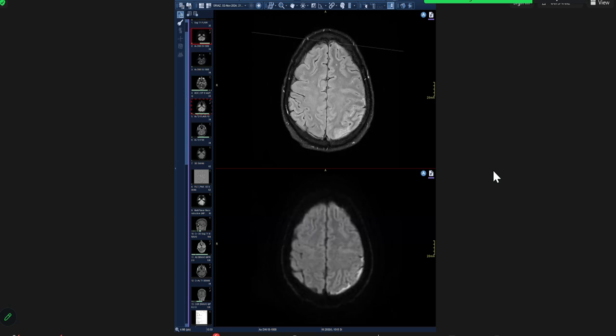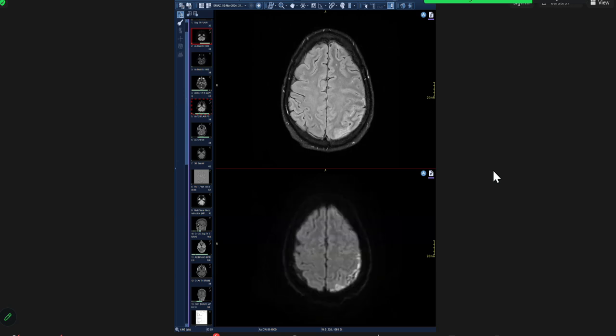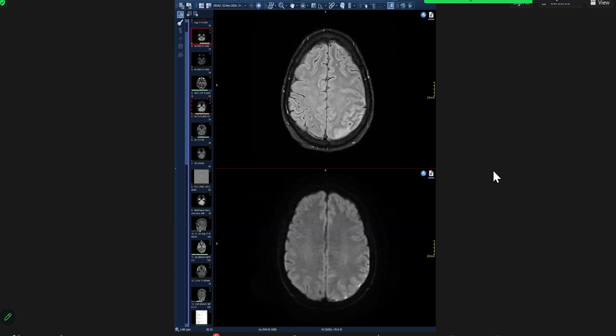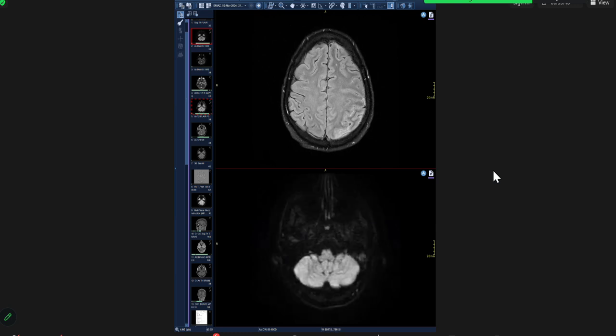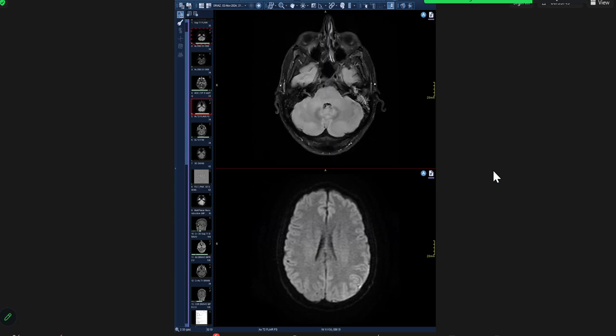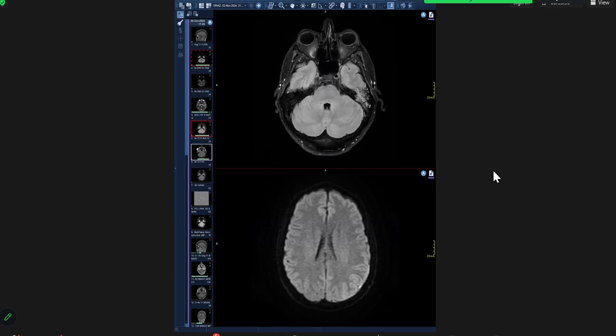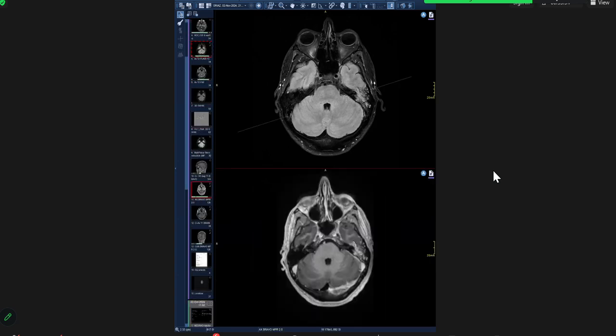It was an abscess. This is all pus, pyogenic meningitis. When they did the CSF, it was frankly purulent, like there was pus. And then you go down and you see this. This is too much. When I showed you the post-contrast images, I kept scrolling and staying here, hoping that you'd see that it's extending into the temporal lobe. Yes, ma'am. There's also cerebritis.